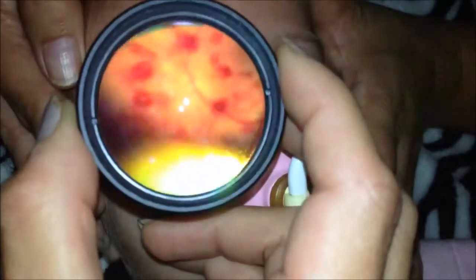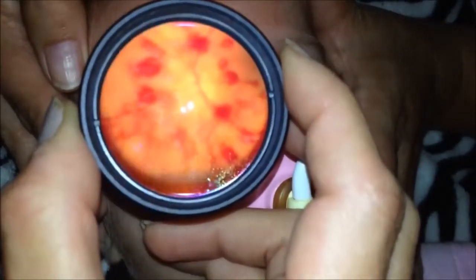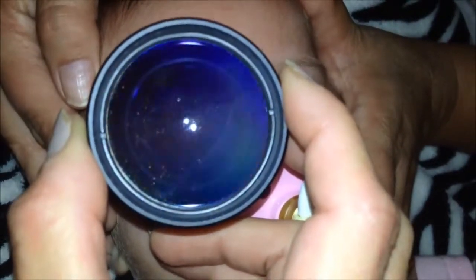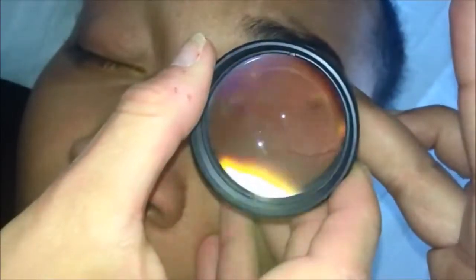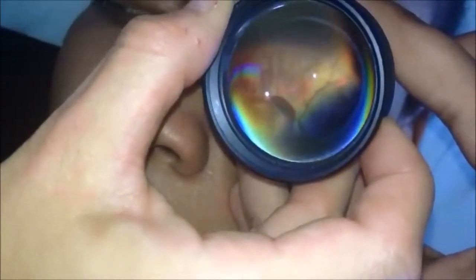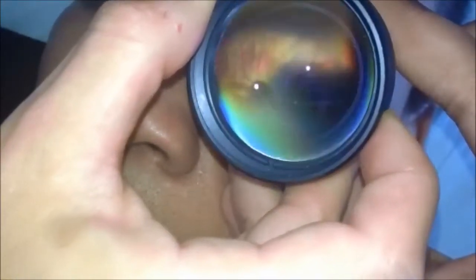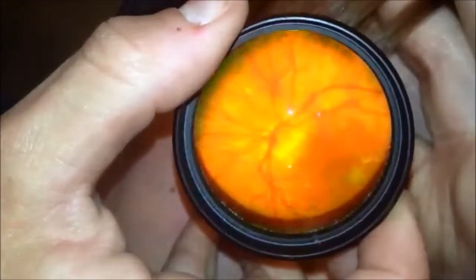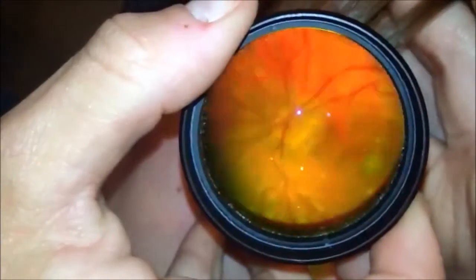The technique can also assist you when evaluating a baby to document retinal hemorrhages, as in this case with shaken baby syndrome. In post-traumatic Terson syndrome, a multi-layer peripapillary hemorrhage can be detected, as well as Berlin's edema or commotio retinae. The activity of choroidal neovascularization can also be assessed, as in this case with multifocal choroiditis.